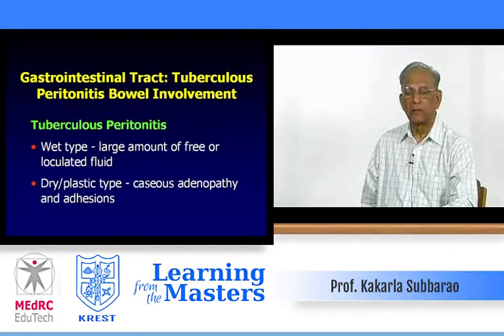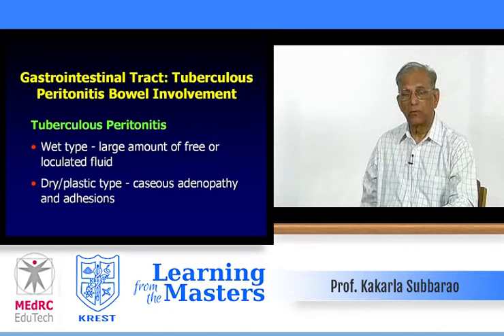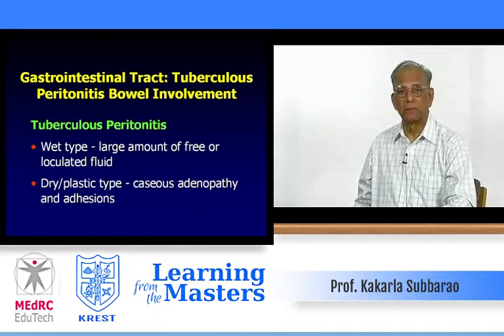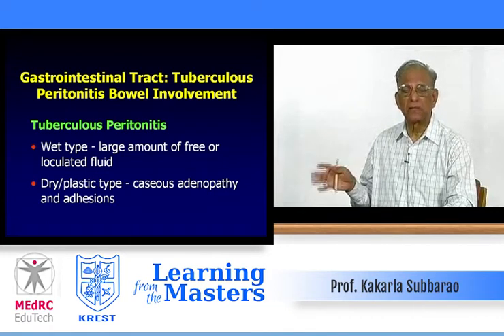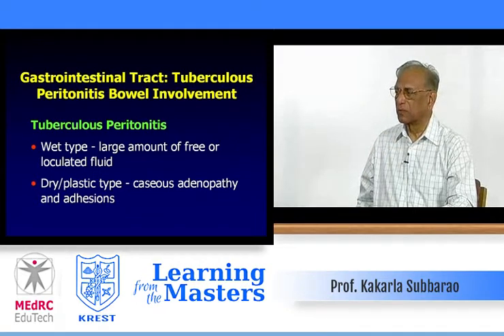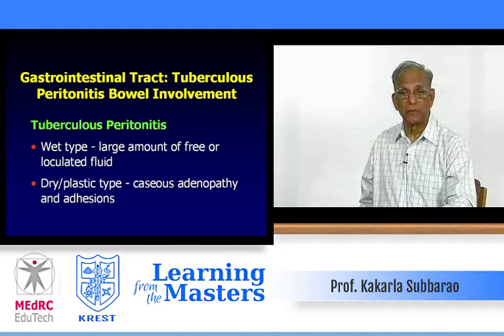Now we come to the gastrointestinal tract. At one time, before the pasteurization of milk, gastrointestinal TB used to be very common. But today, you see it, but it's not because of the milk or unpasteurized drinking of milk. Tuberculous swallowing of the sputum may produce this.